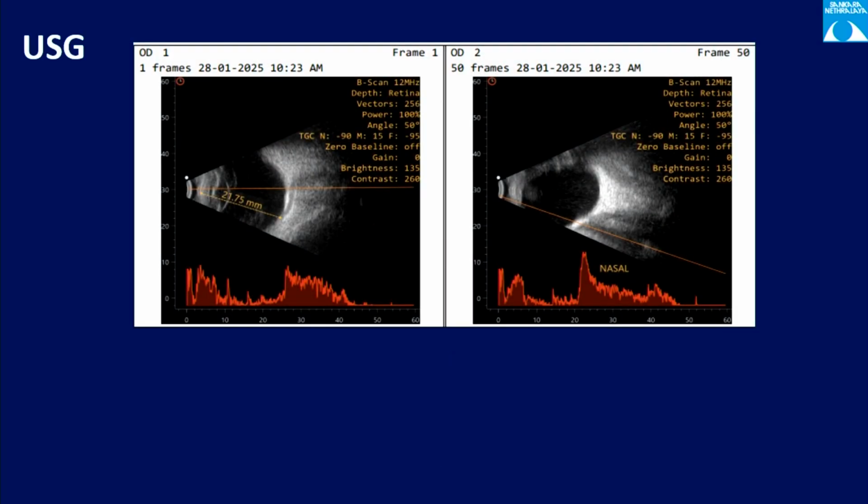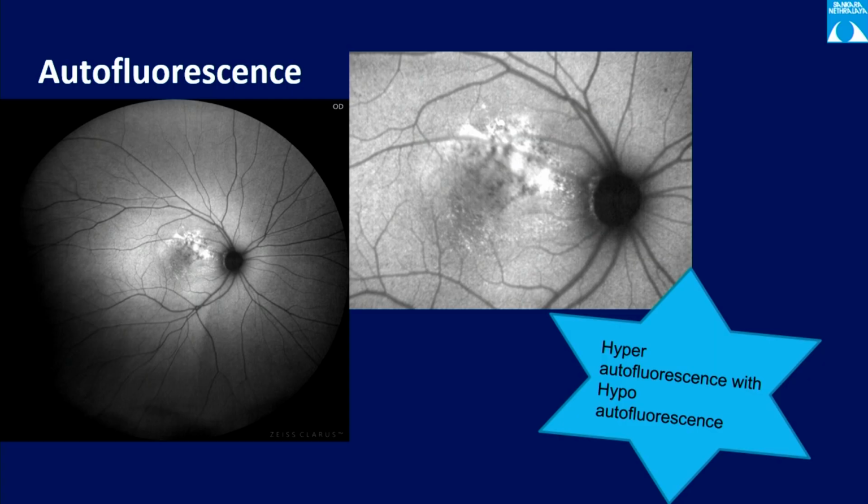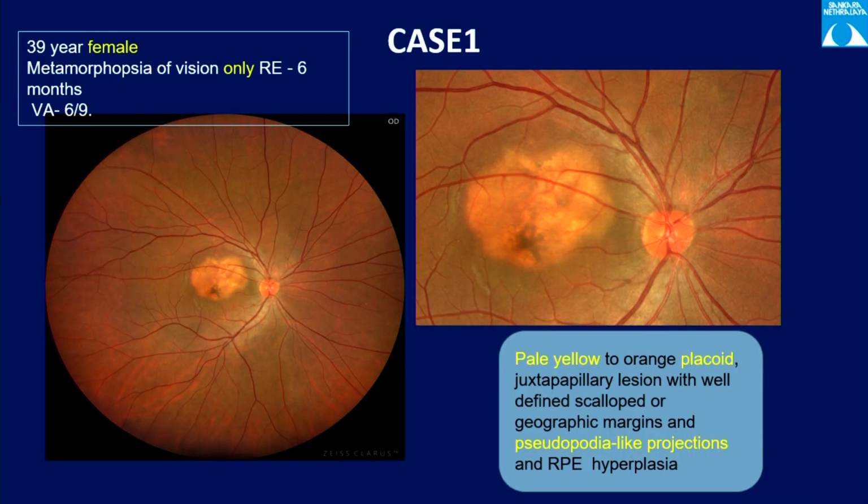Ma'am? You just slow down. See what will happen is if you rush through, they may not be able to digest what it is. So okay, they have to sink in with the image. So like, see, she's going to show you multiple cases. So from that, the most salient feature, you can all see that, and in case you have any doubts, you can ask also. So you can go to the previous image.